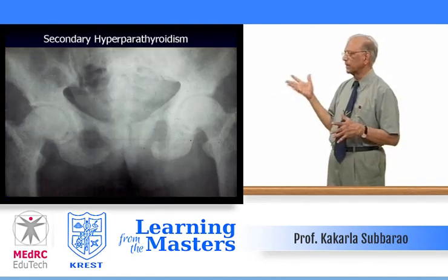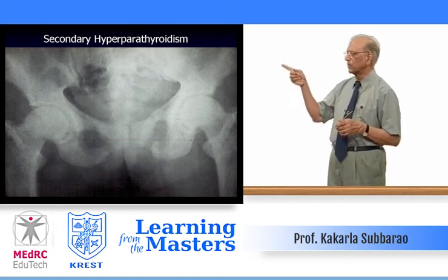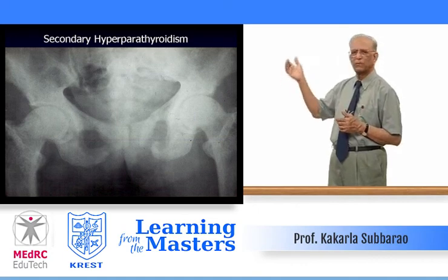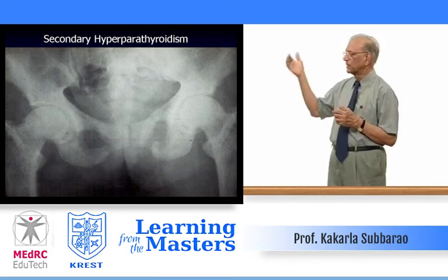Secondary hyperparathyroidism, again, there is osteomalacia, that's why you see the ununited pseudofractures, and diffuse sclerosis with a uniform ground glass type of appearance, whereas in Paget we said a mosaic type of appearance, with bizarre trabeculae, whereas here the trabecular bone is uniformly sclerotic.